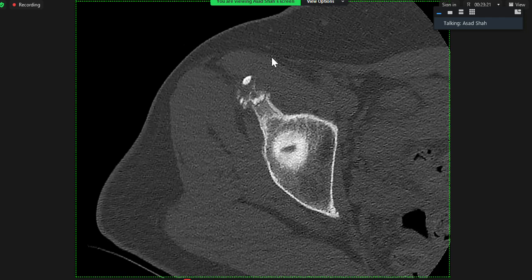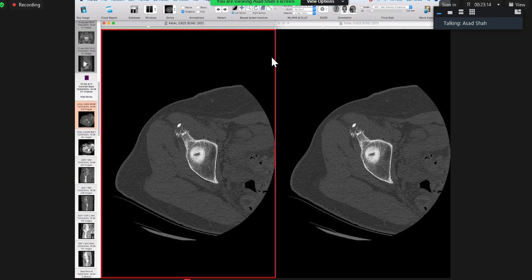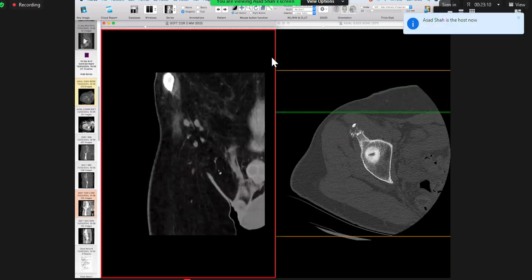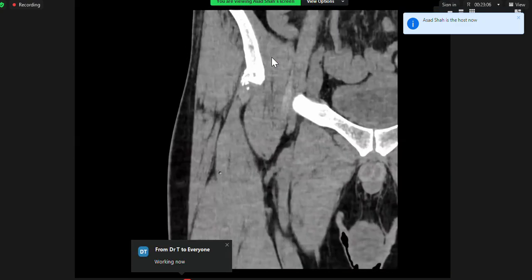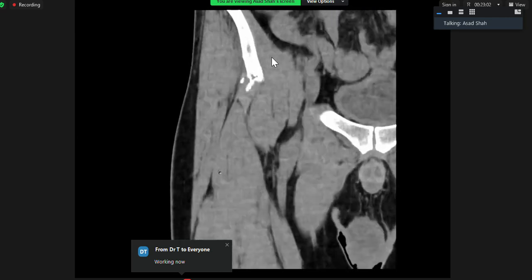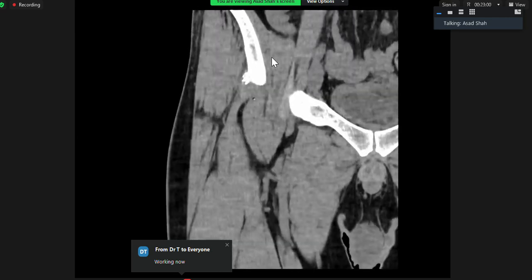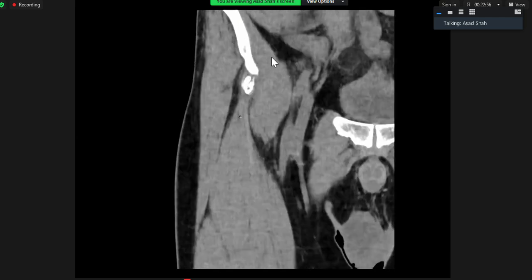What other inflammatory process can you think about that can affect it? Tendinitis. Yes, well, okay, fair enough. That's easy, isn't it? But which form of tendinitis? Synovitis due to some inflammatory process. There you go. So I'm scrolling that for you. This is the straight head of rectus femoris, yeah? And as I come forward, I see some calcification in it. So what is it?